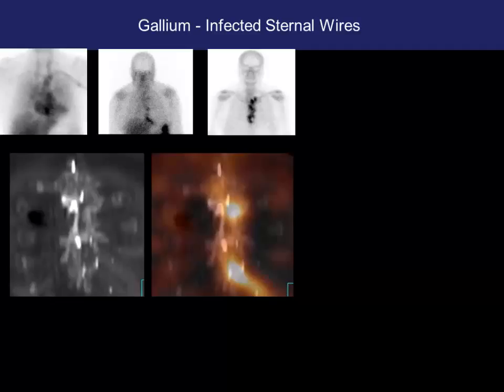A patient who had sternotomy, and there was increased uptake persisting even 3 months after the surgery. The patient had persistent pain, and we did a 3-phase bone scan, which showed increased tracer uptake and vascularity. But again, this is commonly seen in the post-operative scenario because it can stay up to 6 months, or sometimes in patients up to 1 year we see linear uptake in the sternum.